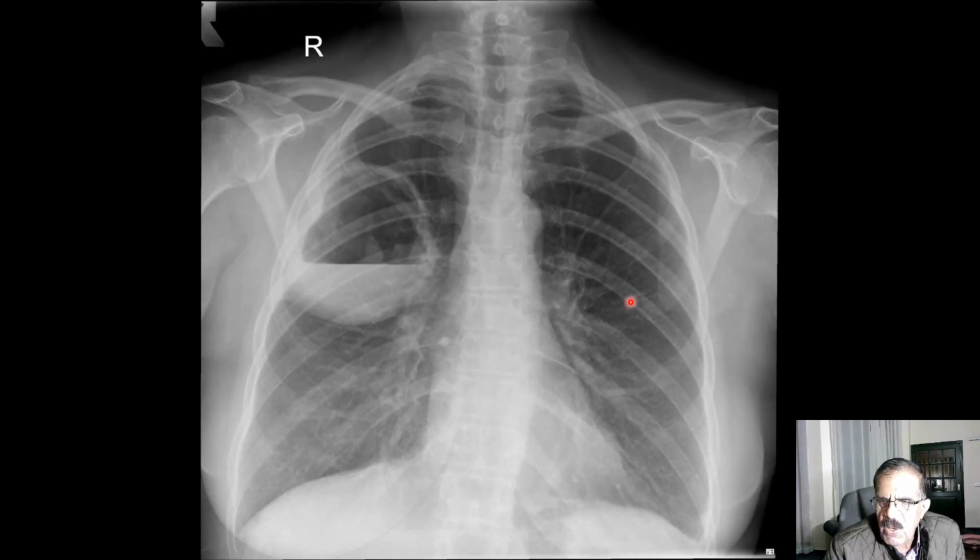Third one is about cavities and about abscesses. Now this X-ray, it is such an obvious abnormality, you don't really need much effort. It is very, very obvious. You can tell that there is a rounded opacity here in the right middle or upper lung zones. I think it's a middle lung. Let me check. This is the first strip. Second, yeah, it's in the middle lung zone. It's fairly large, approximately 8 by 9 centimeters.